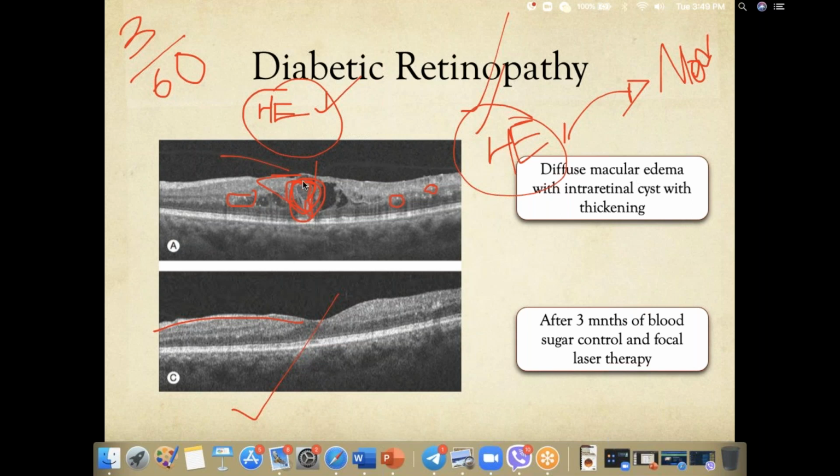So how do you decide is, although initially this was a risk factor and I thought that the patient would likely end up with a poor vision, this has completely healed, right? The retinal layers can be found, 1, 2, even the IS-OS junction is present. The other two hyperreflective layers are present, right? Initially, I do not see lots of splittings.